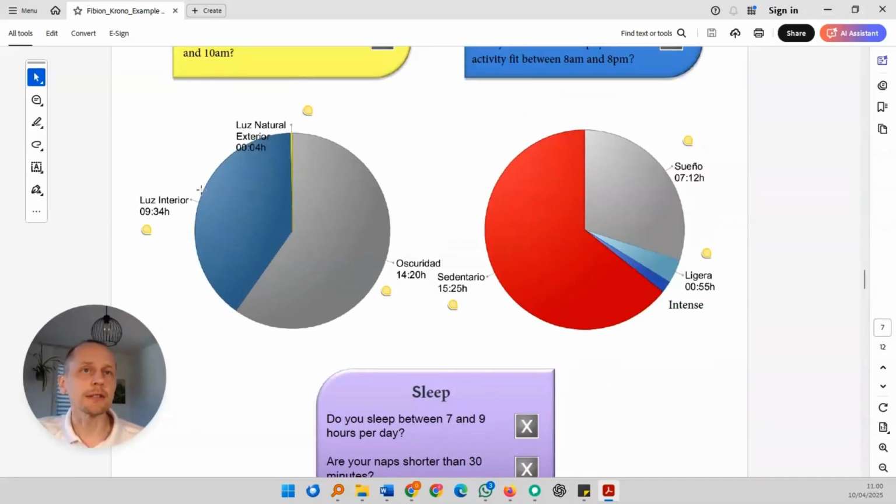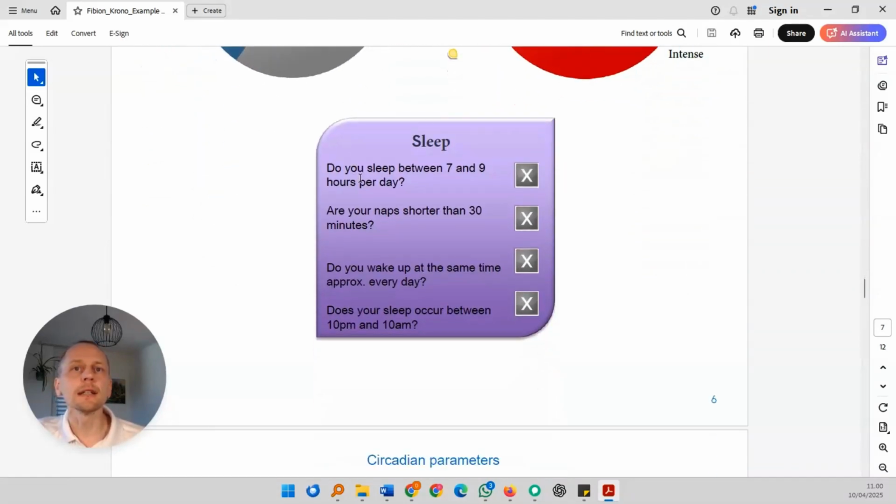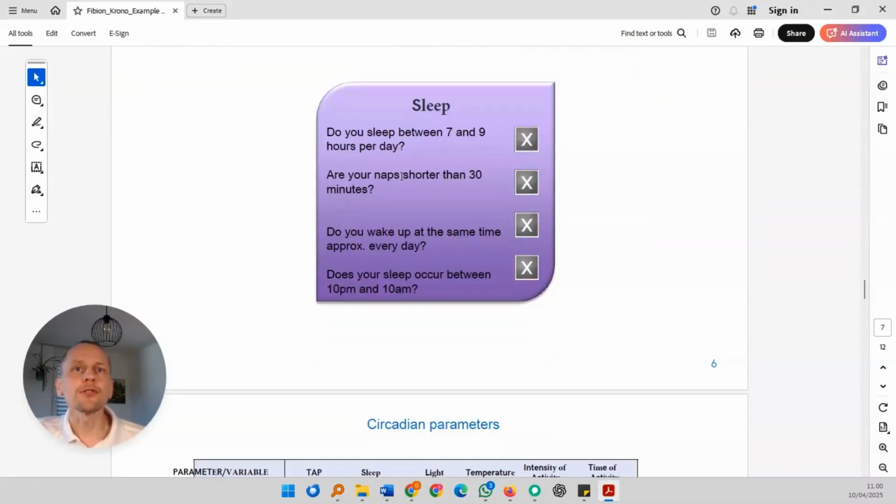And yeah, this one is actually a test report. We are still translating this into another language, so this one is not yet ready. This part we will change.